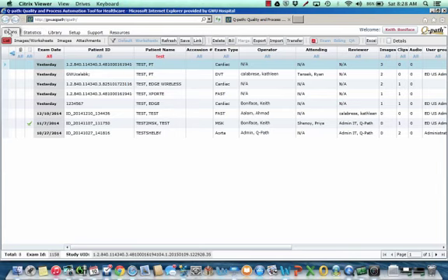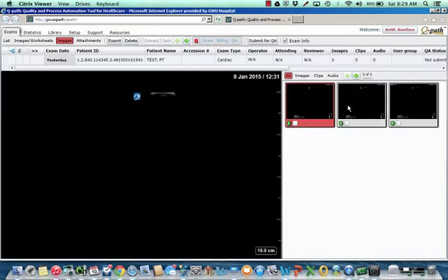And under the exam tabs, there are three different main sub-tabs. There are the images sub-tab. So if you click on there, you'll just get the pictures. And this was just a test exam that we shot. And you can click your way through these pretty quickly by just clicking on the thumbnails, and the video will play automatically.